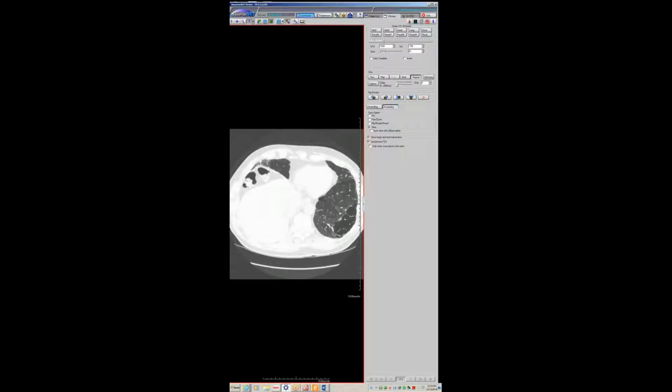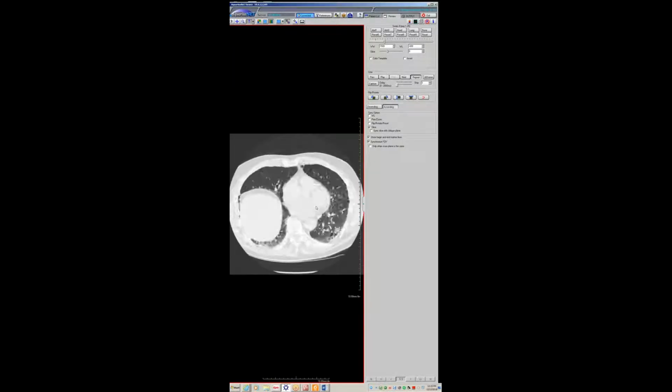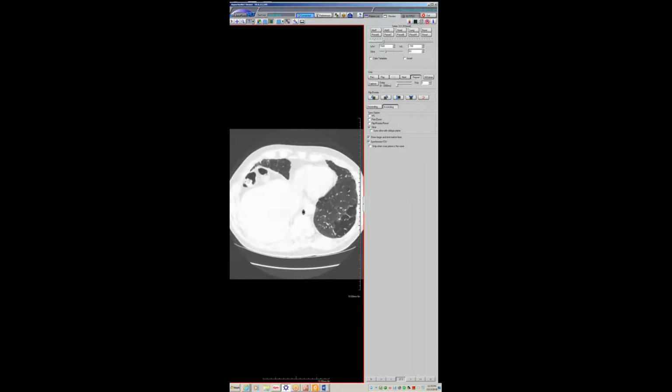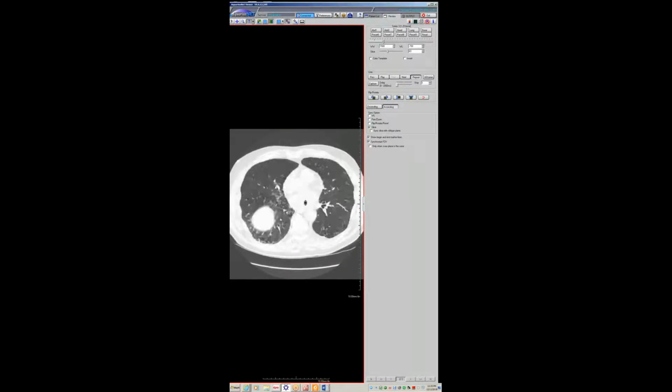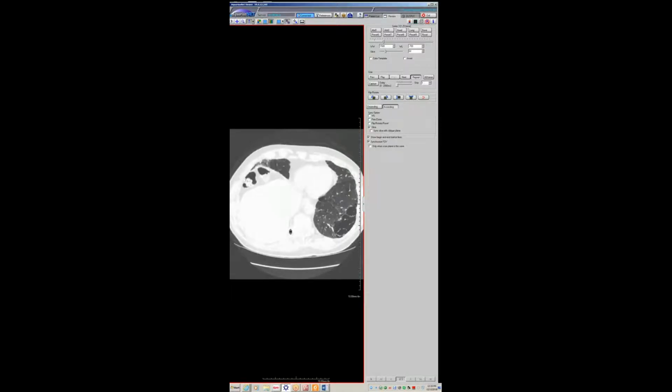And then it collapses down. So I don't know what to call this. I don't know what it is pathologically, but I'm curious what other people call these things. I know some people say, oh, it's airspace enlargement fibrosis, which some of these probably are, but emphysematous spaces shouldn't collapse on expiration.